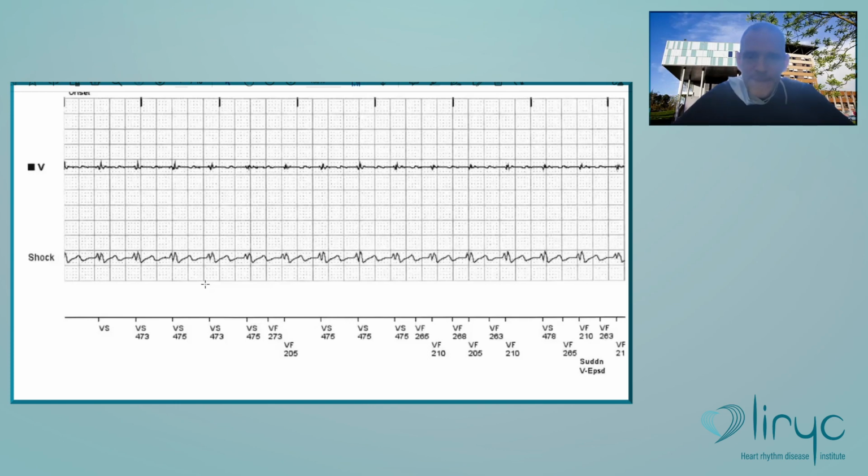Okay. Any question? No. So once more, if you have a look at any textbook about ICDs, you will see that most of the time T-wave oversensing is illustrated with Medtronic or Abbott devices, or maybe Biotronik, but it's never the case with Boston Scientific devices. In the old Biotronik devices, you could also see lots of T-wave oversensing, and this has considerably decreased in their new platforms. They have modified their sensing profile and their filters, and now you have considerably decreased the amount of T-wave oversensing.